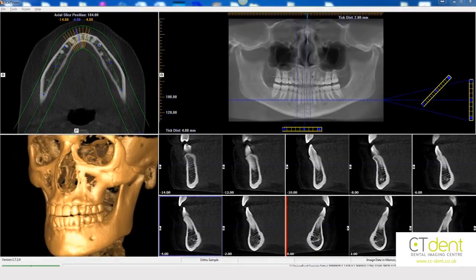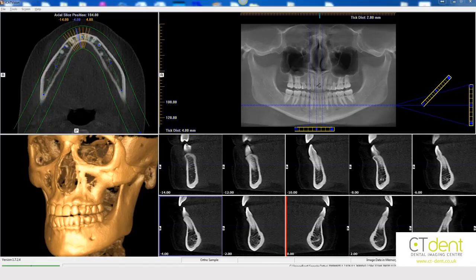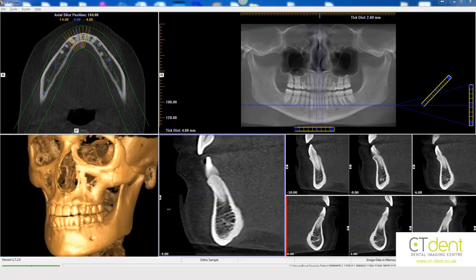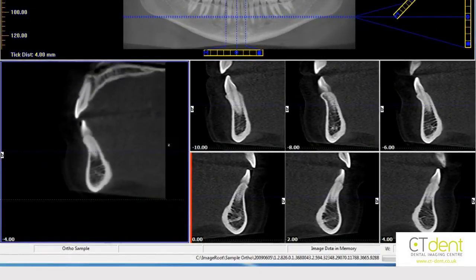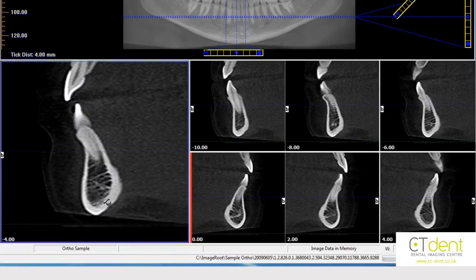These 3 tools are not limited to the panoramic view and can be used in the axial and cross-sectional images. If we position the zoom tool on the central reference slice, highlighted in purple, of the cross-sections, it will increase it in size, making it easier to use for planning implant placement. To return it back to its normal size, click again on the image.